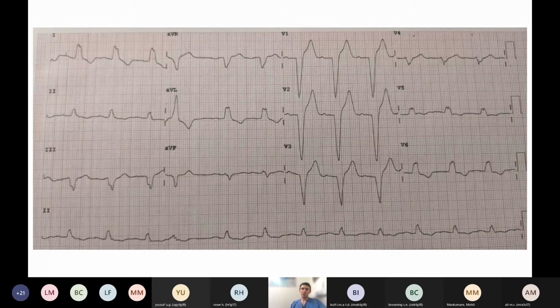Of course, every ECG does not conform to that perfect way of remembering it. I would say we generally look at V1, and if it goes down, it's a left. If it goes up, it's a right. That's the thing to think about. There are other small tricks you can use. I won't bore you with all the small, tiny details that you can go into.